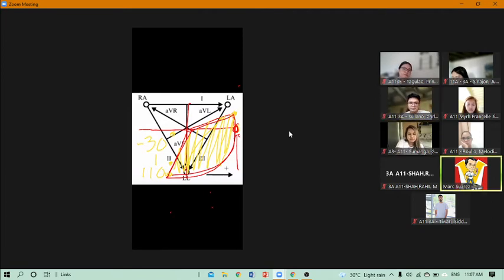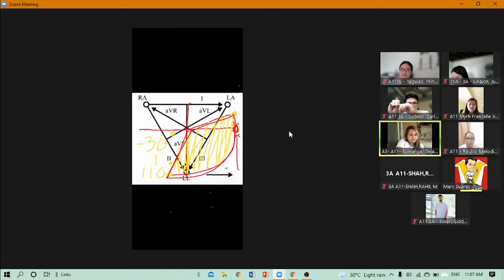How to compute the axis, we will also tackle that later, perhaps this Thursday. Do you still remember how to compute for the axis? 90, aVF. I forgot, Doc.